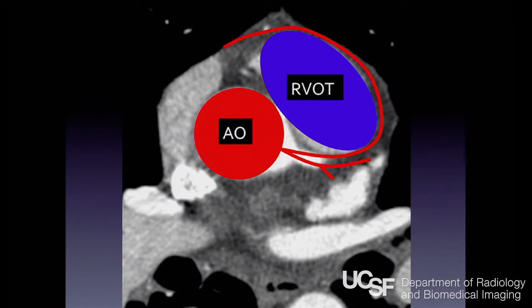One of those ways is in front of the right ventricular outflow tract. The other one of those ways is behind the aorta. Actually, it's very unusual for the right to do this. Usually it's the left that does that, and we'll show you one example of that. But this is called the retroaortic course. And then it may extend between the two, and this is the bad one.